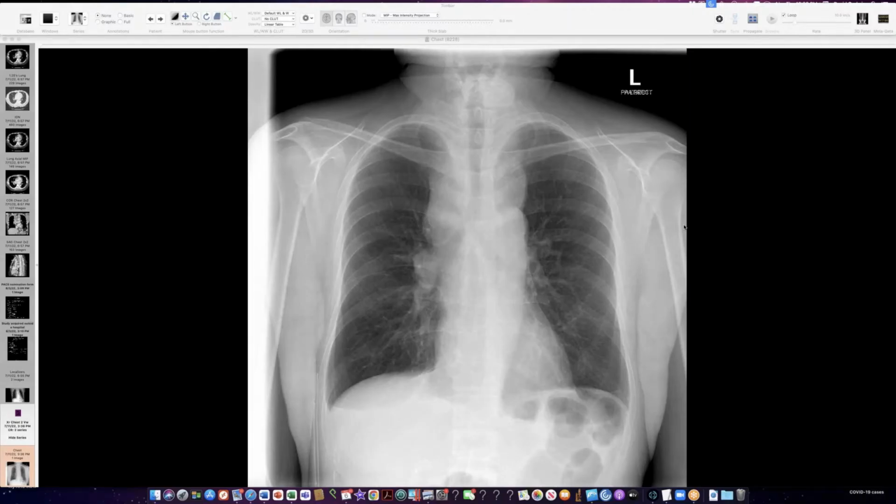Okay, I hope people can see a chest radiograph. This is from a couple of months ago. This person had a liver transplant and then had some symptoms that resulted in a chest radiograph. We see this massive upper mediastinal and right hilar lymphadenopathy. So just a ton of stuff up there that was not there previously.